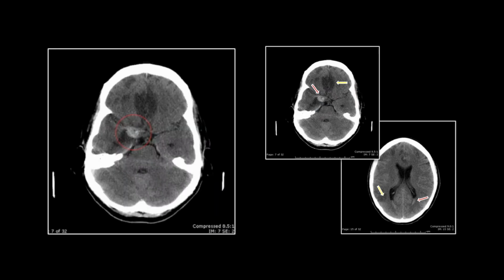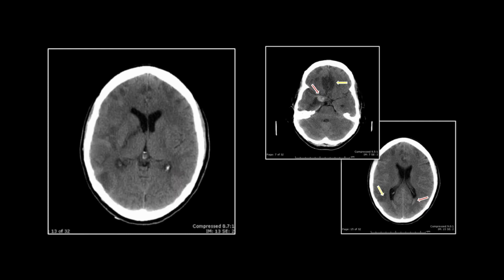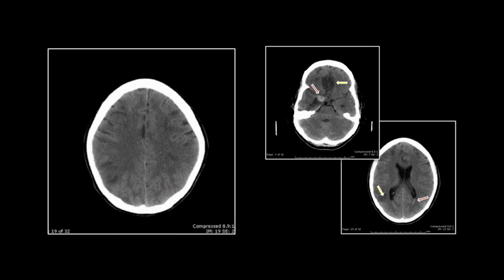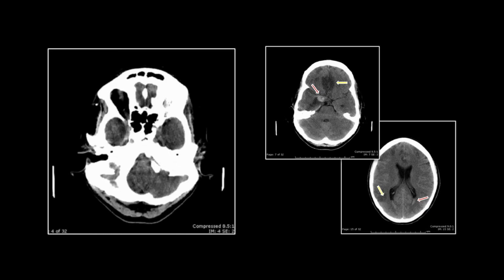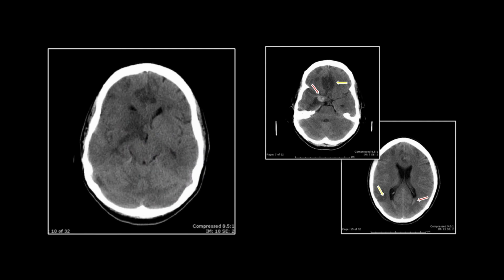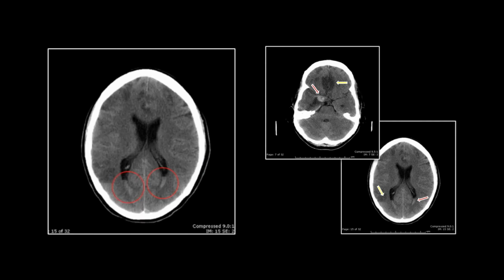This is widespread vasospasm. There was a carotid apex aneurysm that blew, and it caused widespread vasospasm with multiple infarcts scattered throughout the entire brain. The truly amazing thing about this case, look at that involvement all the way up to the top. I'll let that run one more time since it's so impressive. So this is all related to vasospasm, and the amazing thing about this case was that it was all reversible.